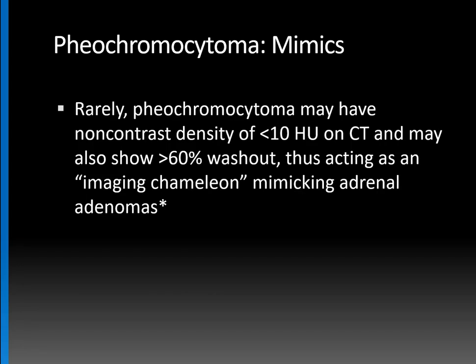Now, unfortunately, a pheochromocytoma can sometimes mimic other tumors. That's because rarely they may have a non-contrast density of less than 10 Hounsfield units on a CT scan, and sometimes also show greater than 60% washout on a multiphase adrenal CT. In that way, they act as an imaging chameleon and mimic adrenal adenomas. And there's a great Radiographics article by Dr. Michael Blake that highlights more the chameleon-like nature of the pheochromocytoma.